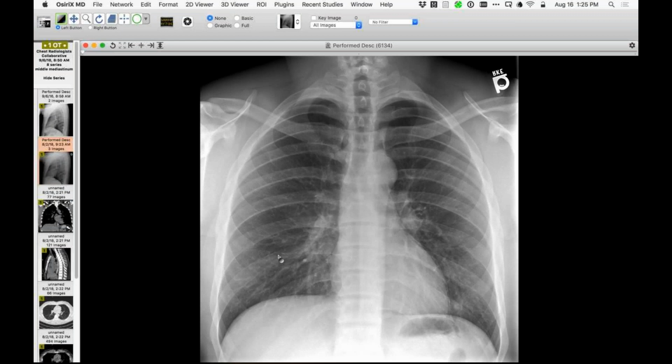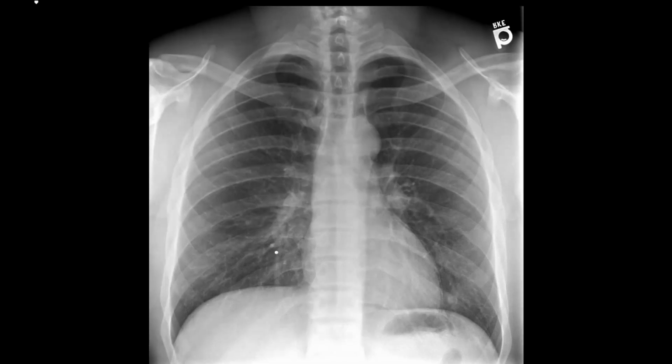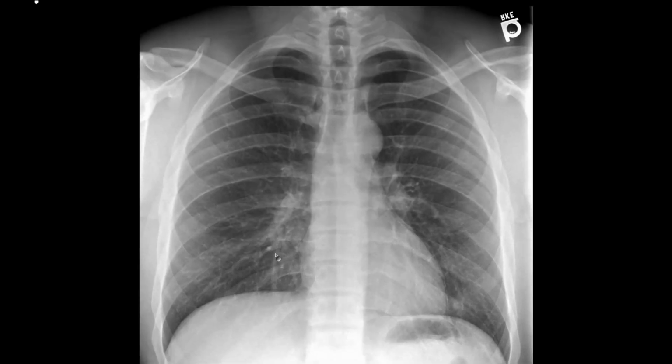All right. So I'll make this up just for fun, perceptual sake. Take a look at that for a few seconds before I give you some context. The findings are really subtle.